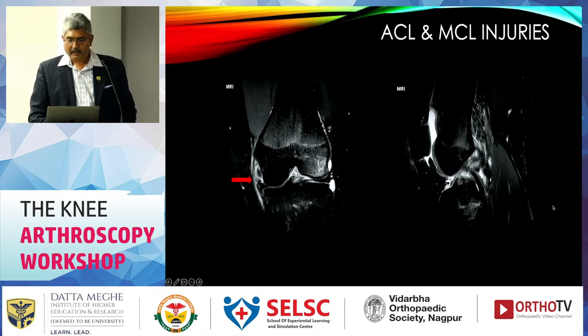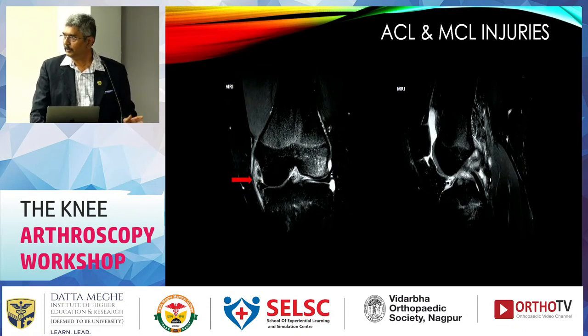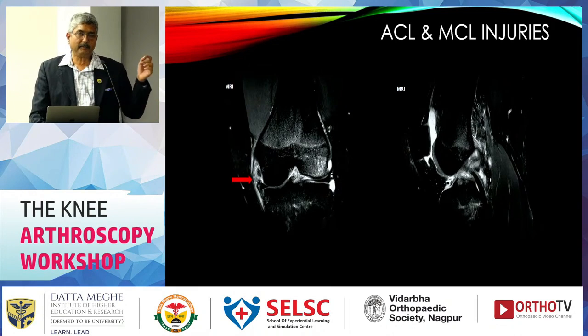Here is ACL tear. So ACL tear along with medial collateral ligament injury, and if associated with medial meniscus injury or the meniscal tear as well, so it is an unhappy tear. So the unhappy triad of O'Donoghue. Am I right? So medial meniscus, medial collateral ligament, and ACL.